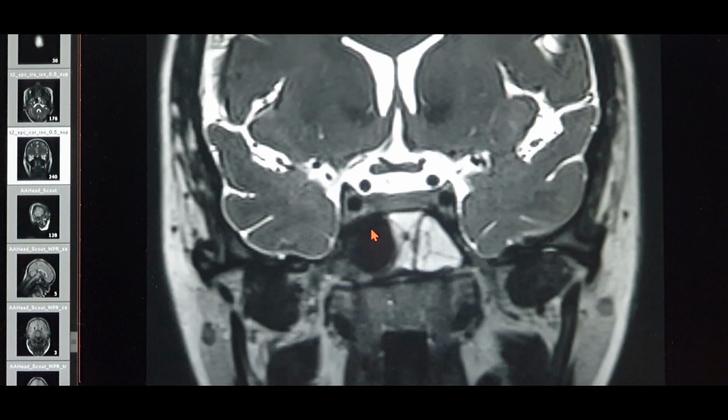Now I'll be making a separate video altogether on the internal carotid artery, where you can see it on an arteriography, MRI, CT, as well as the entire anatomy and clinical anatomy of the carotid artery. So I think this is it. If any PG student or any skull base surgeon or neurosurgeon or any MBBS student is watching this video, I hope all the concepts of the MRI are now clear to you.